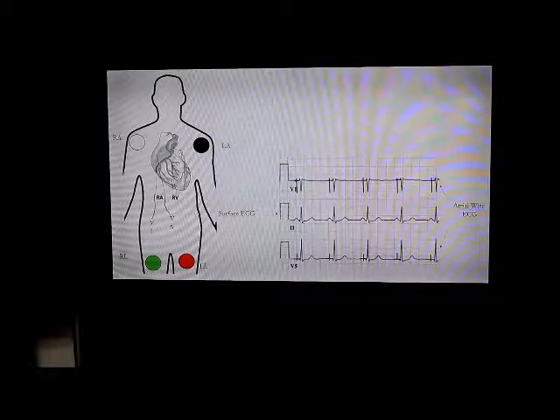And then V1, you will have some spikes in there which will be the atrial spike, and V5 is the same. Okay? So the reason you do this is that if you connected the wires to the limb leads themselves, you're going to have spikes everywhere. So sometimes it's difficult to tell which is the QRS and which is the spike, the atrial signal. So I like doing this because here you have the surface ECG.